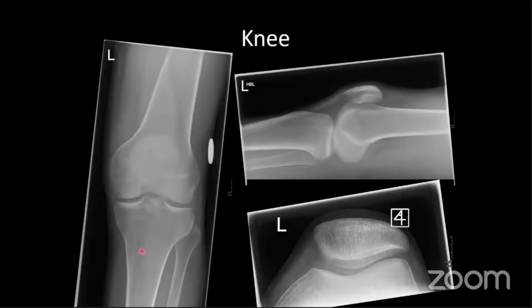So there's the normal frontal AP view of a knee, and then an important view, which I'll explain why we need to do, is the horizontal beam lateral, abbreviated to HBL. This is a true lateral film, which means the patient is lying on the table with their leg out flat, and we rotate the beam of the X-ray to take a picture from the side. The reason we do this is to look at knee effusions. But I've got an example of that later.